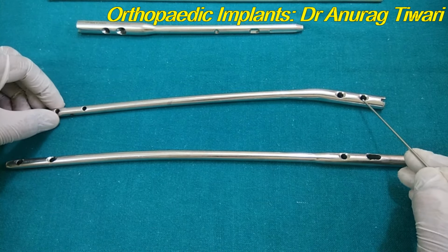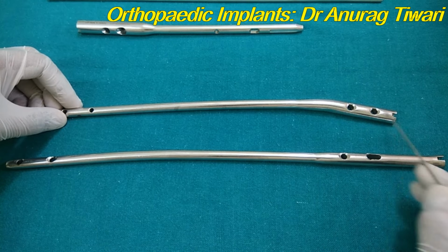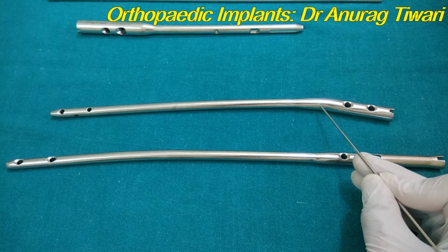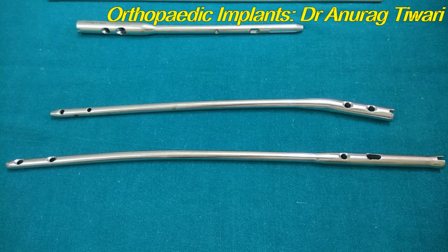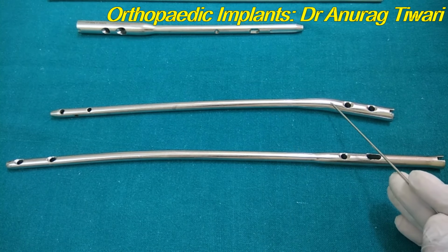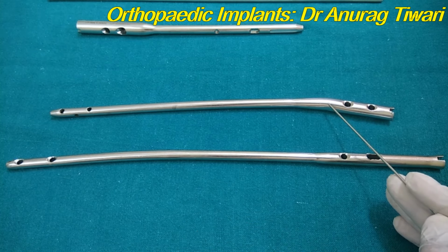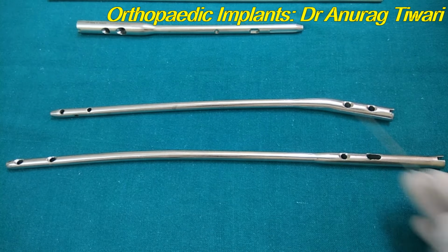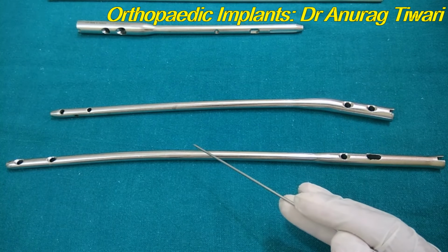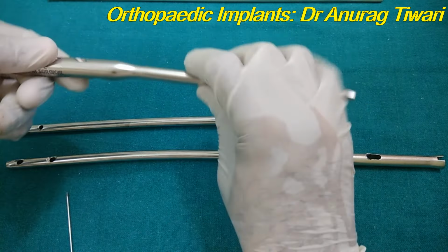Now this one is the tibia nail. How to identify the tibia nail? I have already told you that there will be a Herzog bend of 11 degrees at the proximal fragment because the entry site for the tibia is eccentric, whereas in the femur it is through the center of the medullary canal. But in the tibia it is not through the center, it is eccentric, quite anterior to the center of the medullary canal. So to accommodate this eccentric entry point, they have made this bend so that you do not perforate the posterior cortex while doing the entry. This is the main reason why there is a bend, and this is the tibial nail.